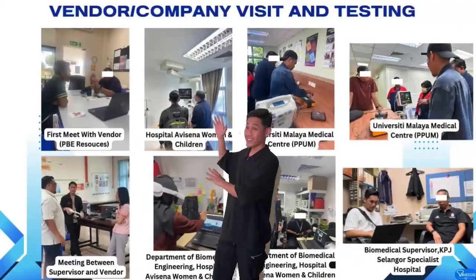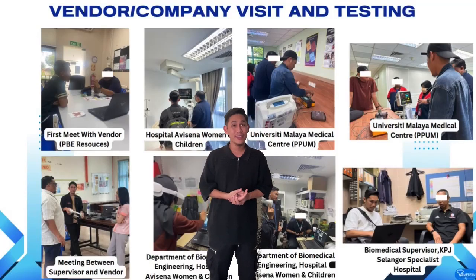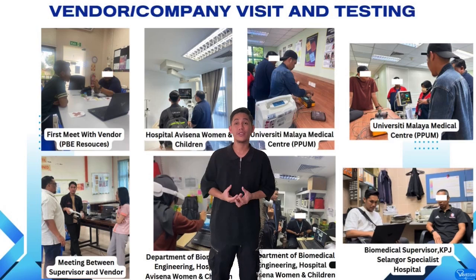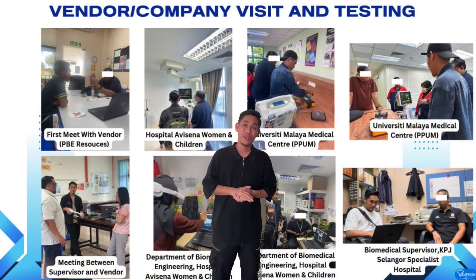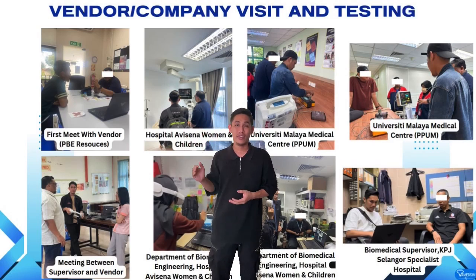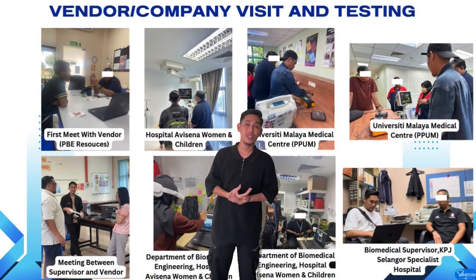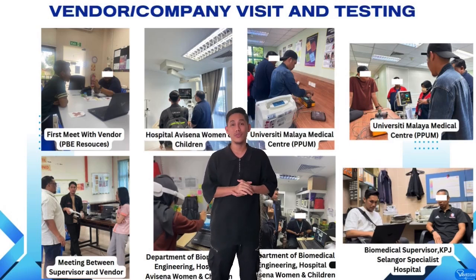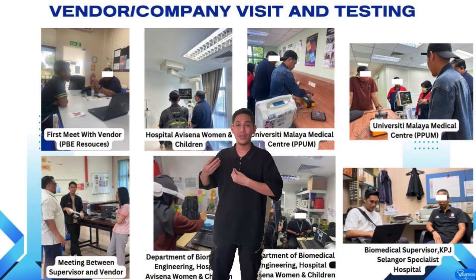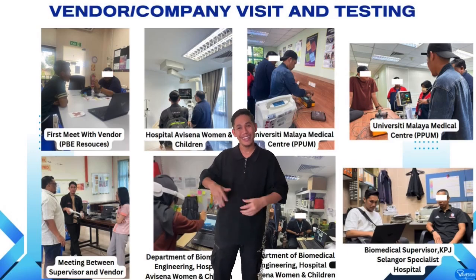Alright, like you can see here, I went to many medical centers to collect the data to develop this project and make this project a success. I went to the medical center to collect the data one by one, and then I developed it one by one using Unity for the simulation and 3D design. So without wasting our time, let's go to the video to see how the simulation plays, or the demo of this project. Right, let's go.